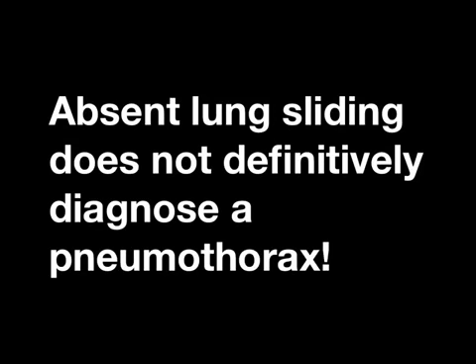So remember, absent lung sliding does not definitively diagnose a pneumothorax. In the right clinical context, it's highly suspicious for the diagnosis. So that leads to the question, is there a way that ultrasound could be used to definitively diagnose a pneumothorax? And the answer is yes.